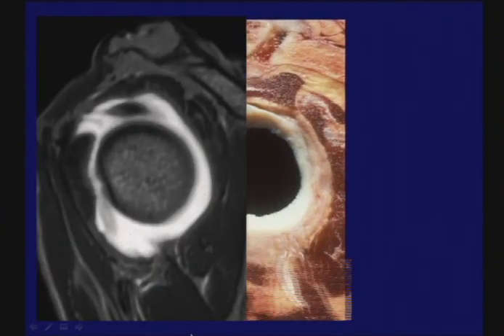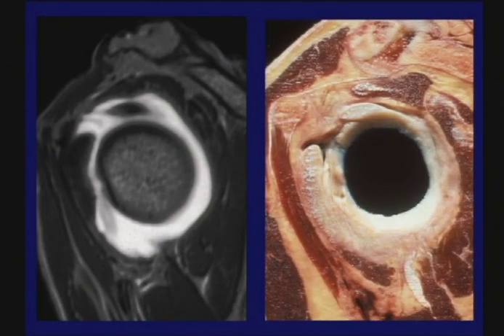They brought me our first sagittal oblique MR images, and again, I was very, very impressed that we were seeing structures that really were more numerous, and we saw them with more detail. We saw portions of the biceps. Again, this is an old image, not great, but there were at least some soft tissue structures that we could see. We'll be talking about those.